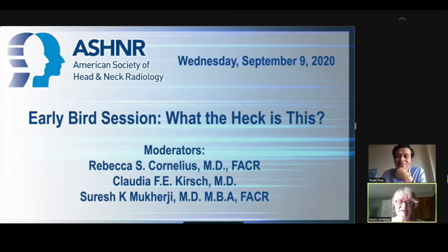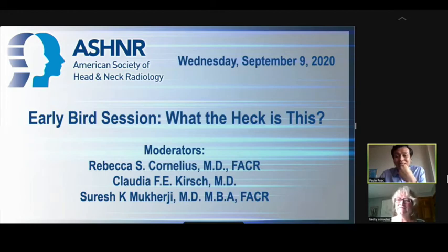I'd be interested to see from the chats how many people have seen one of these. I've certainly never made this diagnosis, or if I saw one, I missed the diagnosis. Have you seen one of these before, or is this the first case you've seen? Yeah, this is the first case that I've seen, and it was really interesting. Nobody expected this diagnosis, and I think it's important to include it in our differential whenever we see a lesion that doesn't match features of truly benign or malignant. That's kind of the middle, and I think it's a good consideration to have it from now on.